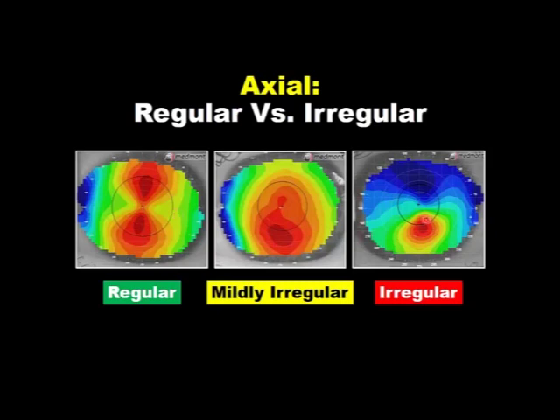By comparison, this patient doesn't have one hemisphere a mirror of the other. Superior of the pupil is not a mirror of inferior of the pupil. This is our keratoconic patient, our irregular corneal astigmatism. Then in between, we can see this patient may not correct to the highest level of acuity. Would you expect this patient should achieve 6/6 or 20/20 vision?